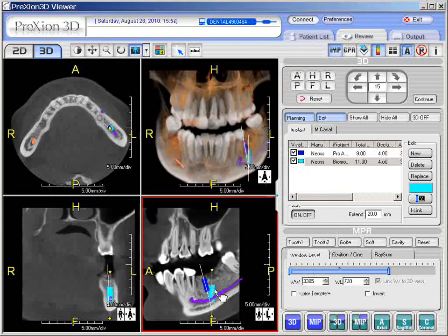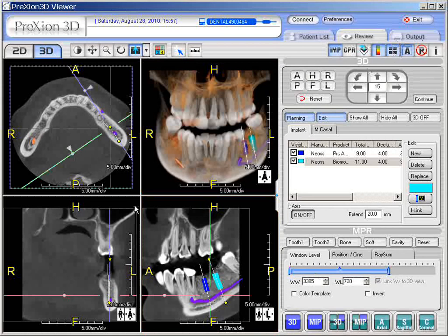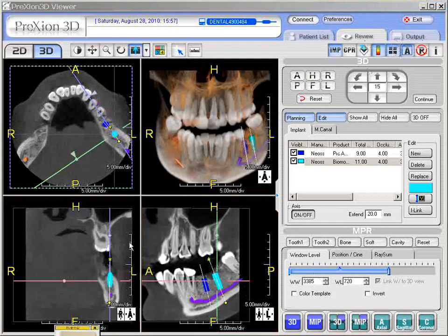So I purposely made this bigger for a demonstration. Now we're going to put it in position, and we're going to take our little yellow star and swivel it in position. And now again, since we don't see it in the other views, remember, let's hold the Alt key. First you're going to put the crossbars on, and hold the Alt key again, and click right on the new implant. And so we've got it lined up in 3 views. And then we can make our further adjustments and align it.